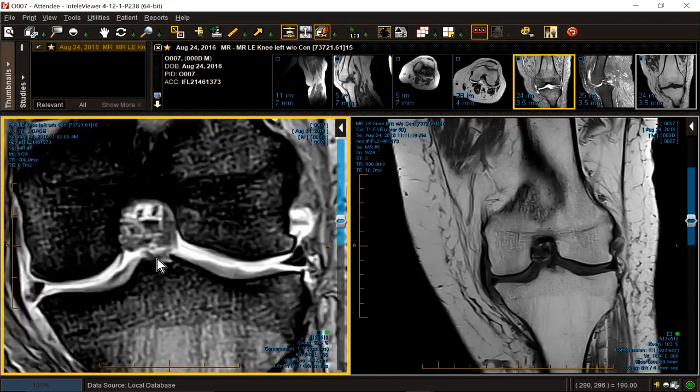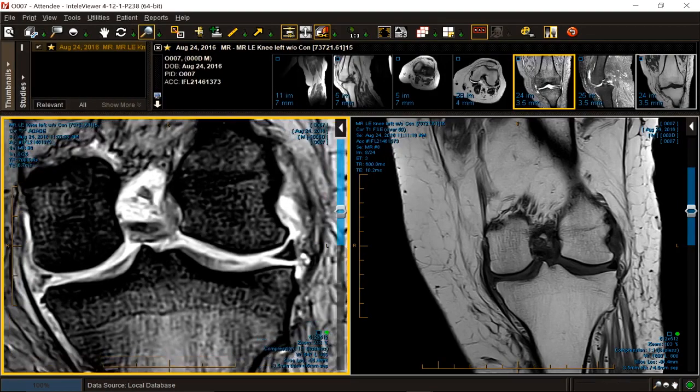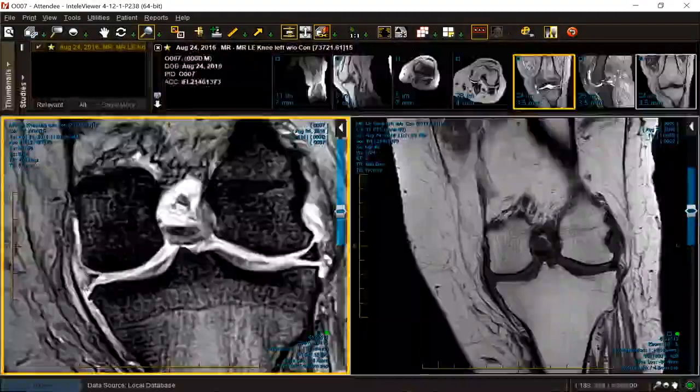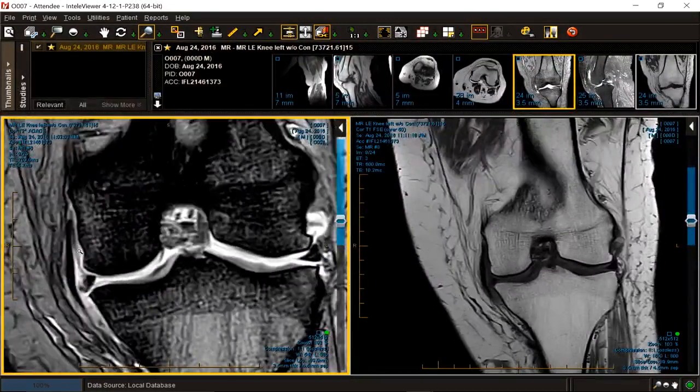I see the tibial end of the anterior cruciate ligament. I see my posterior cruciate ligament. Let me mag out a little bit. And I've got my superficial bundle of the MCL, middle layer of the MCL, deep layer of the MCL, which, by the way, doesn't look so good. The coronary ligaments are irregular. The meniscofemoral ligament is a little floppy. The posterior oblique ligament coming from the back of the knee right there is intact.